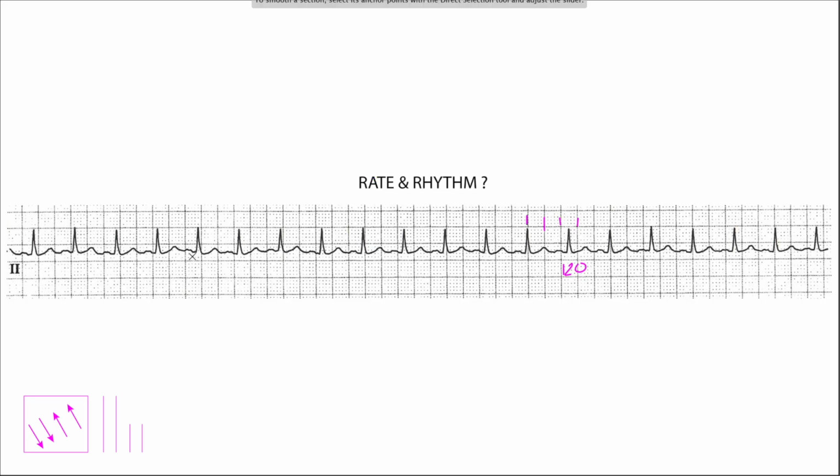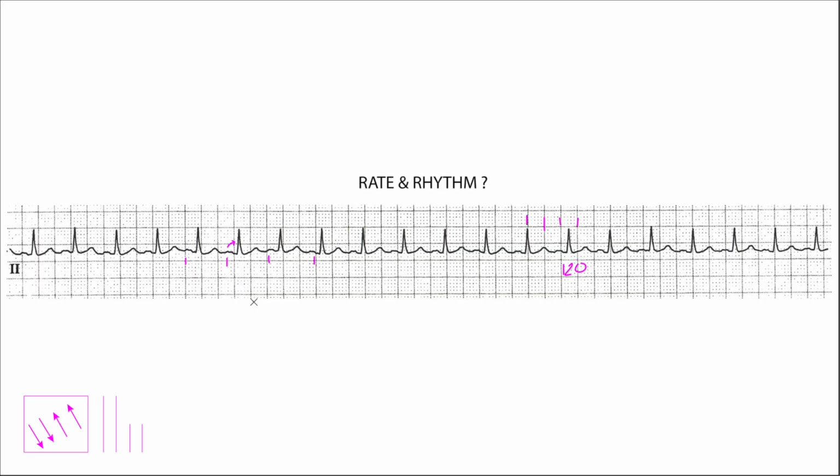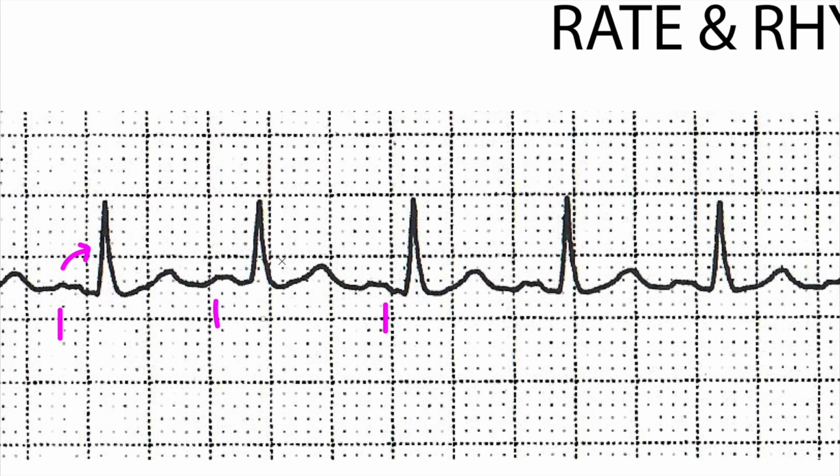The atrial rate, or the P waves, they seem to be present before every single QRS, right? So they appear to be married to the QRS, or they are giving rise to this QRS. So this seems to be an atrial rhythm. Whether it's coming from the SA node, we'll see that in a moment here. So we have our rate, 120. The atrial rate seems to be the same, right? And anytime somebody mentions rate, your response should be a rate of what?